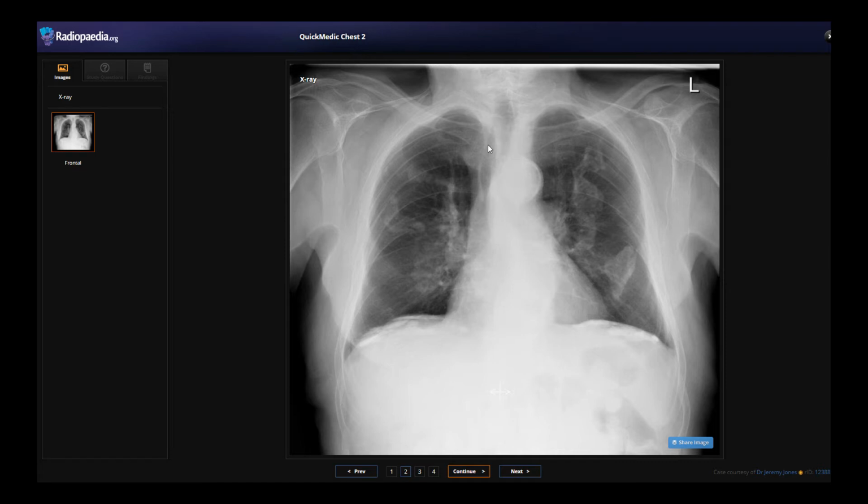We should then look at the lung fields, B. Looking across, there definitely seems to be very distinct borders of these ribs, and going down there looks like quite thick lining of this side of the lung as well. The diaphragms are both quite flat, and going across there doesn't look to be any pneumothorax. Within the lung fields, however, there are strange opacifications here. That's sort of an L-shaped one here, there's one here, there's one here, and there's one here. So this is all quite abnormal looking.